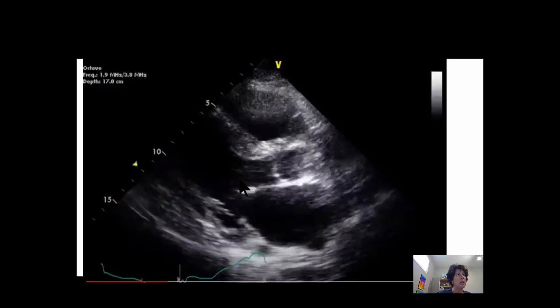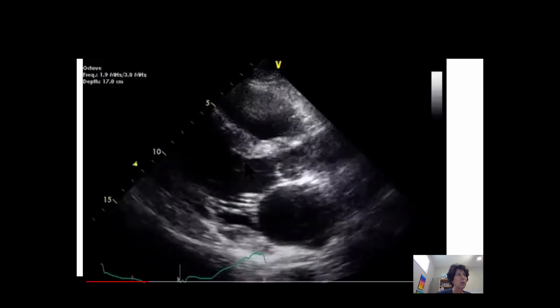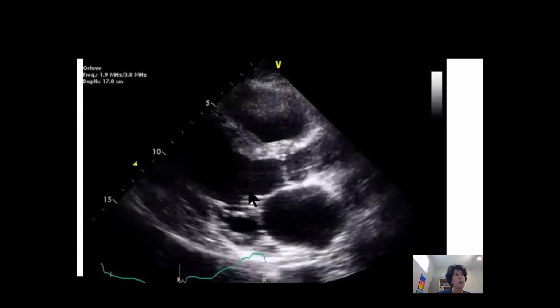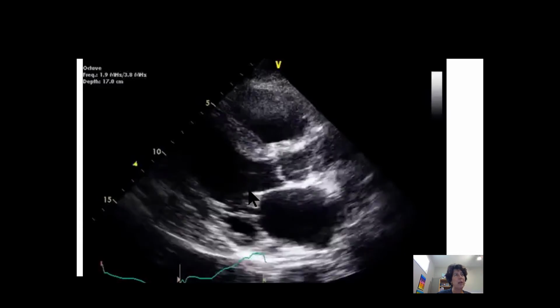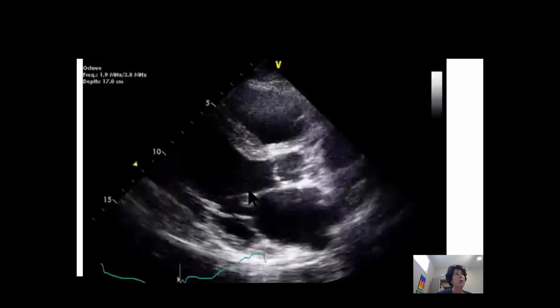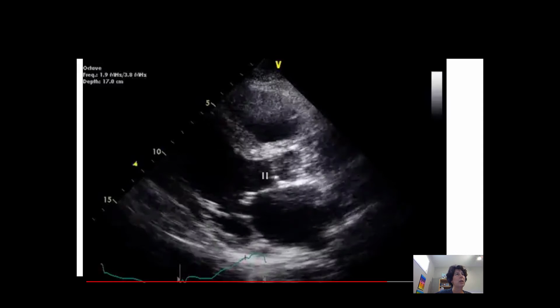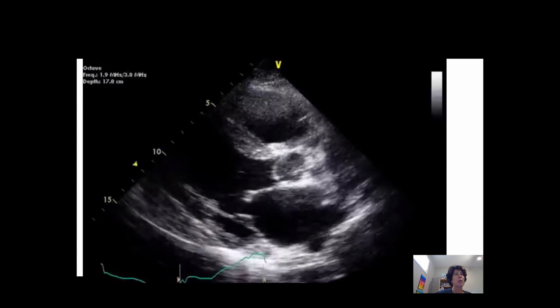So this increase in septal separation or this decreased motion of the anterior leaflet, I think we would have to consider a possibility that this is a low flow state, so somewhat poor cardiac function. So those would be two things we could start putting on our potential short list for things wrong with this heart. So on to the next loop.